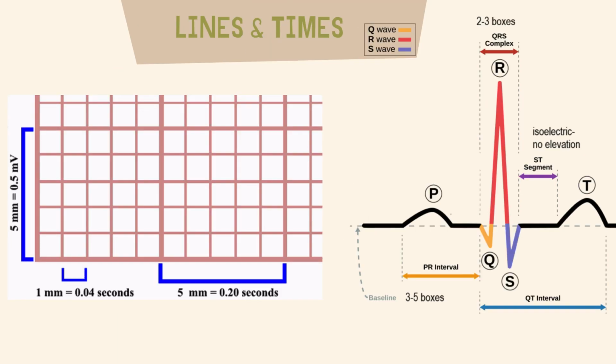Okay, now that we understand this beautiful system, let's look at the EKG paper, because sometimes looking at an EKG paper feels like a foreign language, and if we don't understand it, the rest doesn't make sense. Some of you probably already know, but let's review. Basically, the EKG strip is a graph. There's time on the horizontal axis and voltage on the vertical axis.